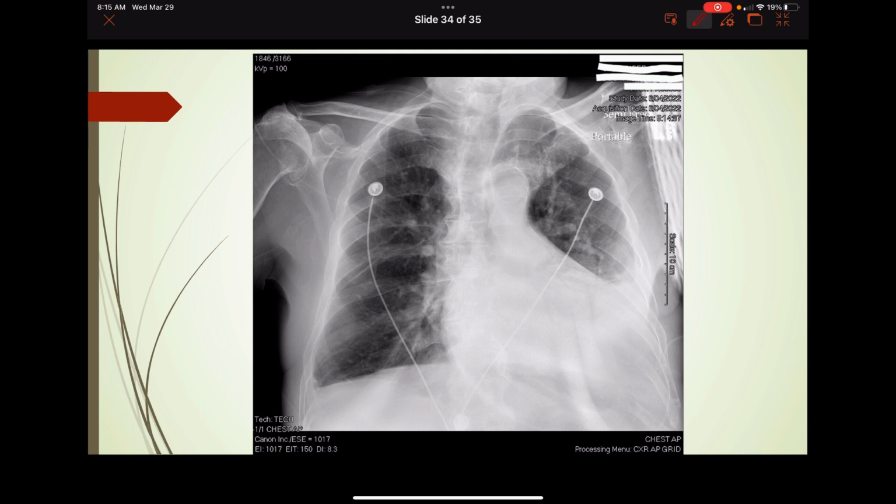And this patient here, A for airway, carina, B for bones, ribs. Ribs on the left side look okay. Cardiac silhouette, can't see it here because of big pleural effusion. Diaphragms, can't see it as well because of the pleural effusion. Right side has a small pleural effusion, left side has a large pleural effusion. So this patient needs a thoracentesis.